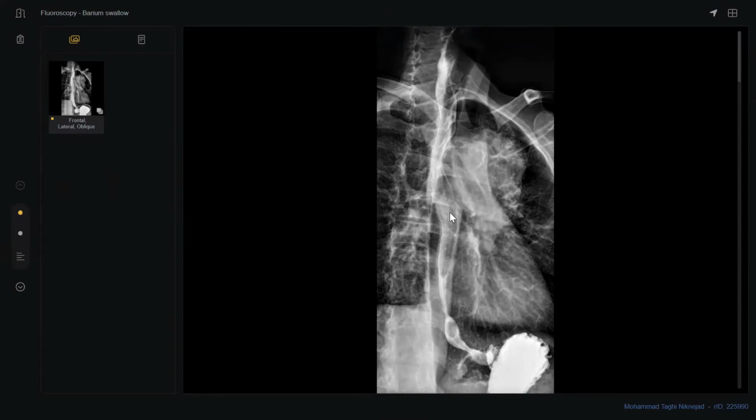Okay, and this is, by the way, not calcification. Why? Because if you look inside it, first of all, the density is not dense like bone or calcium. Second, it contains some air inside. Even if this were calcification, it would obscure everything.